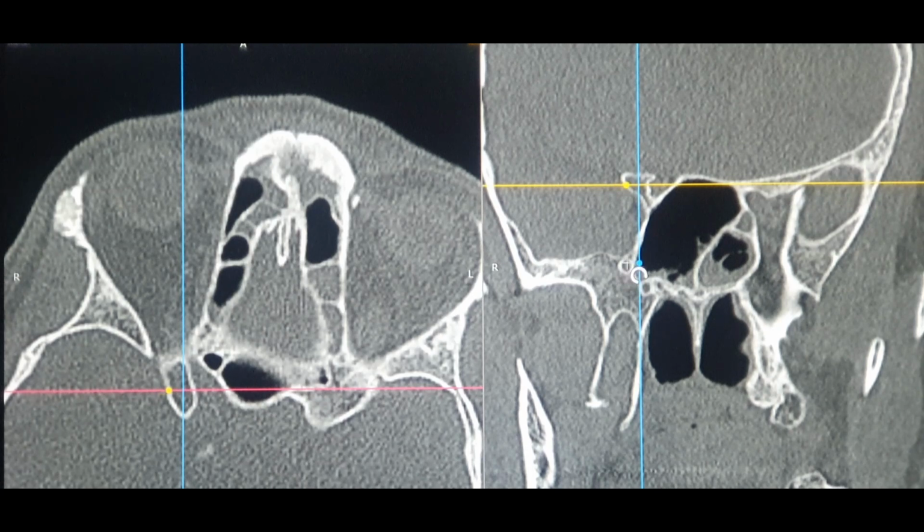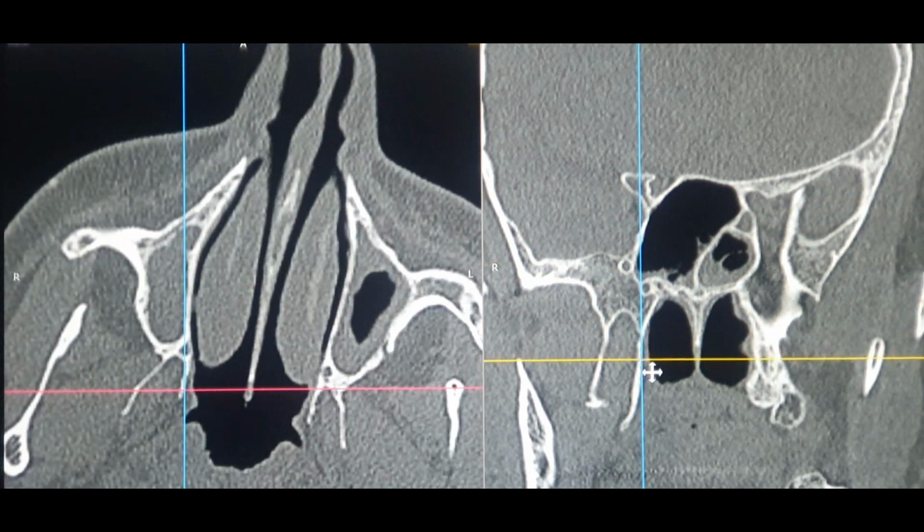And here you can see the two plates: this is medial pterygoid, that is lateral pterygoid. So if I can show you the medial pterygoid plate on the axial scan, as shown before, this was the anterior lateral, posterior, medial wall of the maxilla. That's the cheekbone, which you can feel on your cheek, where you can see the infraorbital nerve over here. And that's the medial pterygoid, and that's the lateral pterygoid, very commonly seen. So that's the same medial pterygoid, and that's the lateral pterygoid. So axial section becomes quite easy now for you guys.